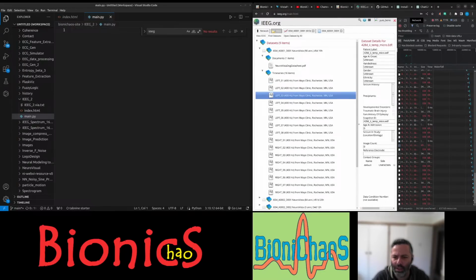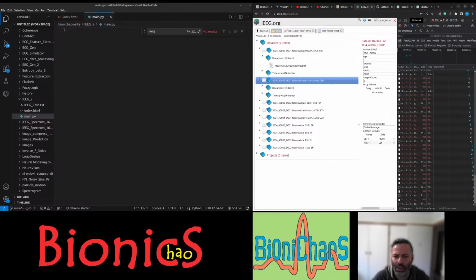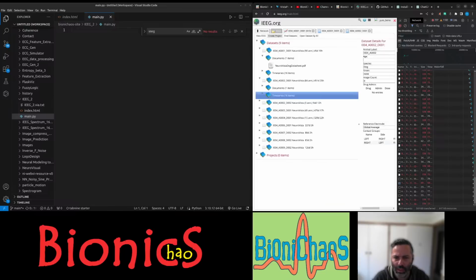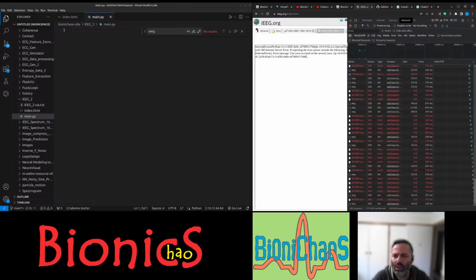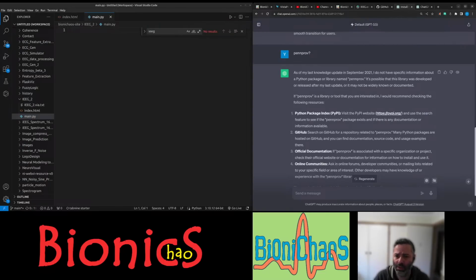Already open. It's already open. And view doc. No, still not working. That's okay. We're mainly after the data. We need the data. Yeah, so it's loading something. It's getting some errors and things. I think it's actually trying to do something with my profile over there. I think eventually it will work. Anyway, long story short, the data is there. That's what's important.